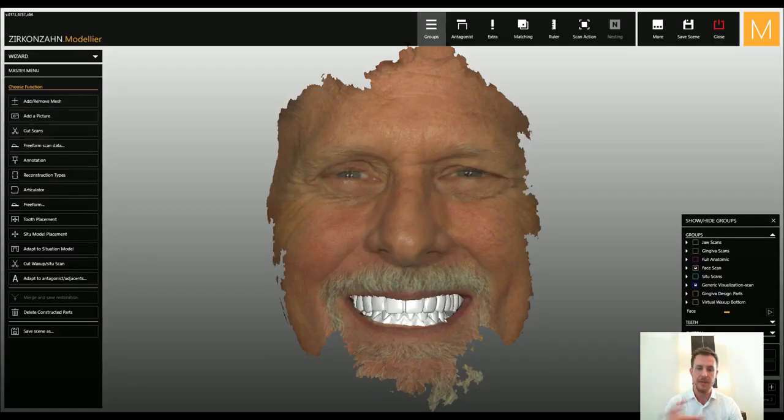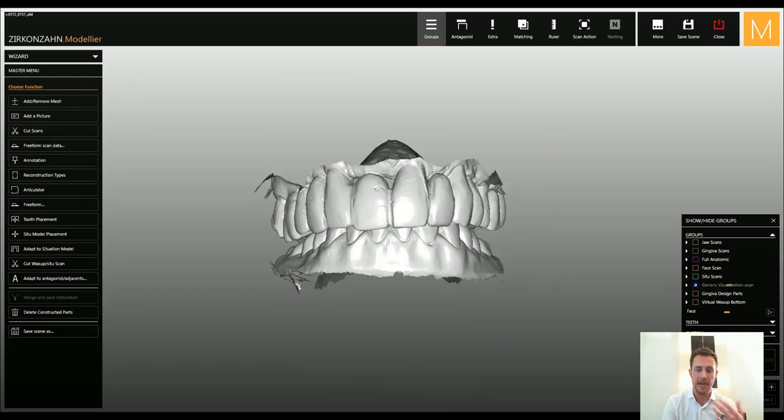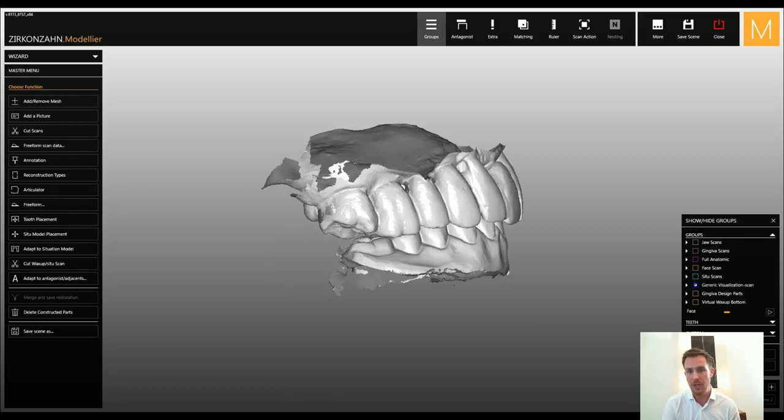I received all kinds of information from the doctor, like facial scans and intraoral scans, and also everything made with a plane finder to capture the natural head position, etc. My job is now to do a tooth setup beforehand, because we later use this tooth setup to make the prototype, and for the planning process with the implants, and so on.